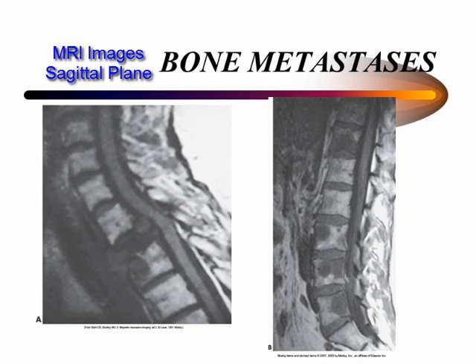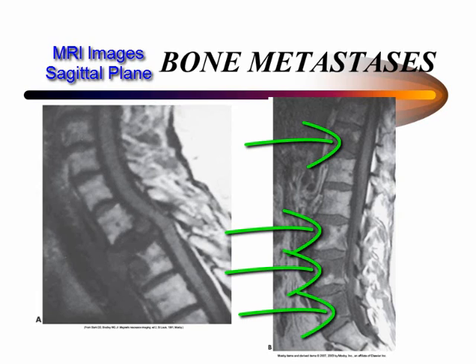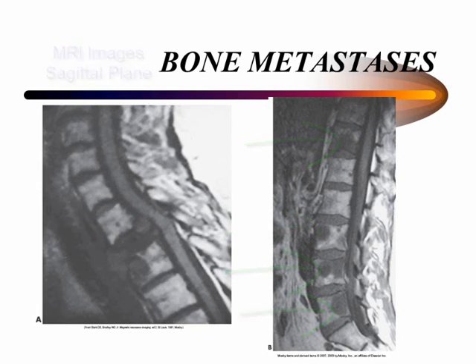In the image on the right, we're looking at an MRI image of the lumbar region, and there's vertebral metastases from breast carcinoma, and there are many lytic lesions that are evident on this image. This concludes Part A on the skeletal system.